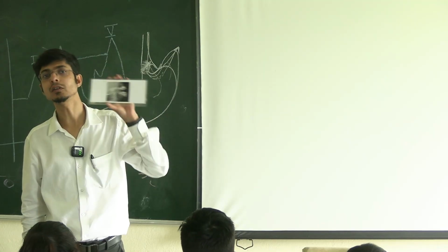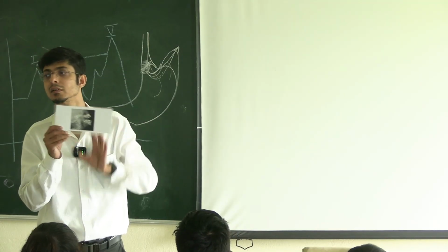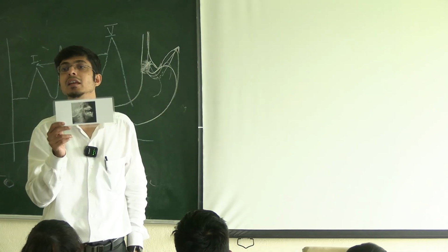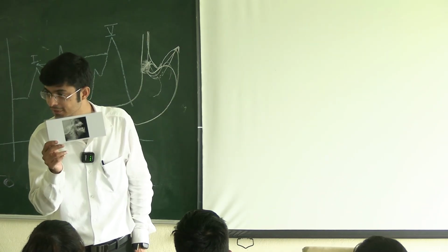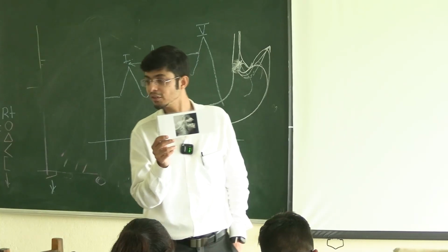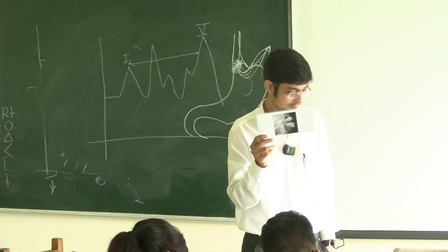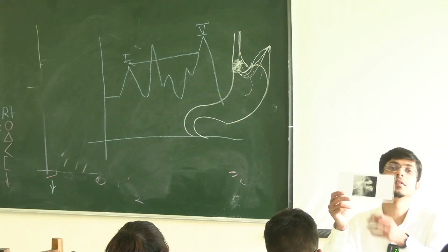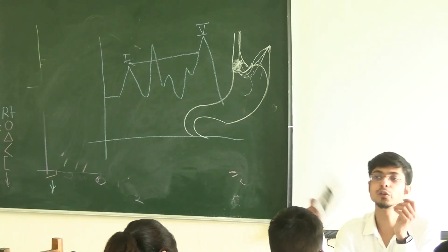And what does this show? Okay. Enlarged adenoids. Okay. Adenoids are normal, everyone will have. Okay. So okay, you want to circulate this?